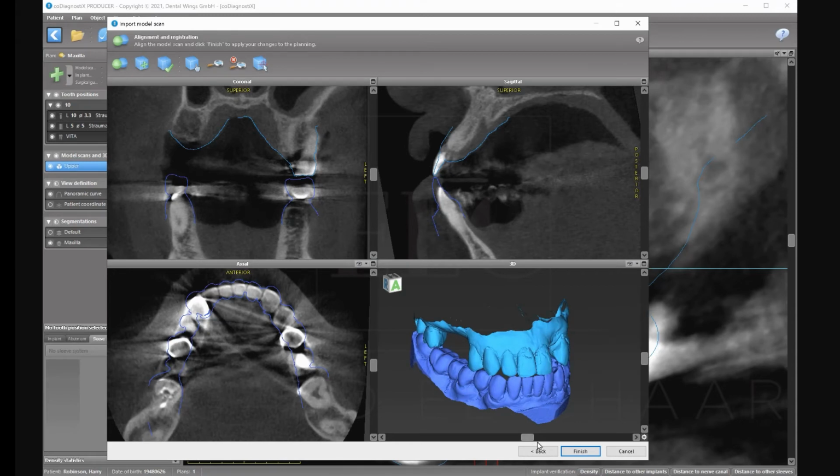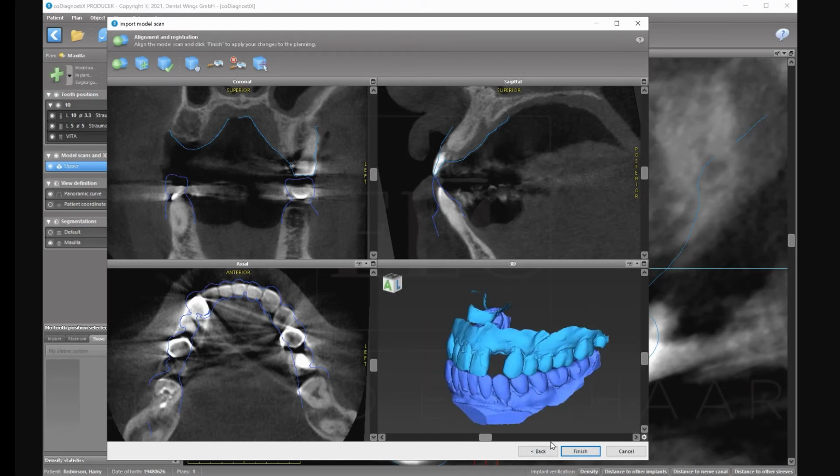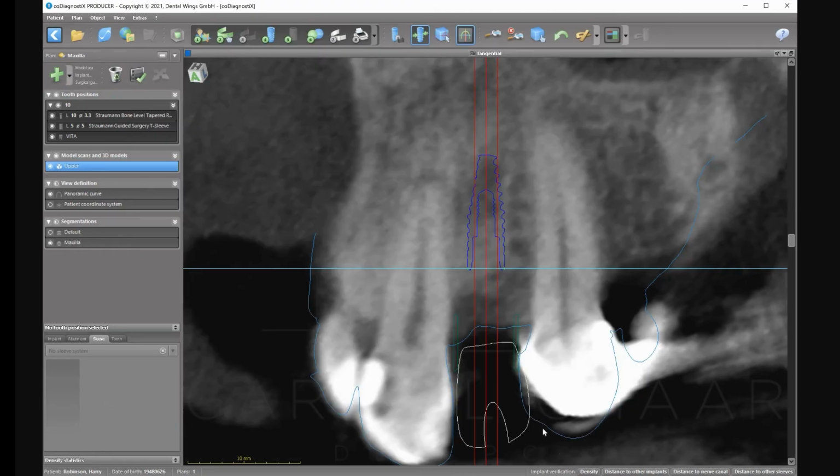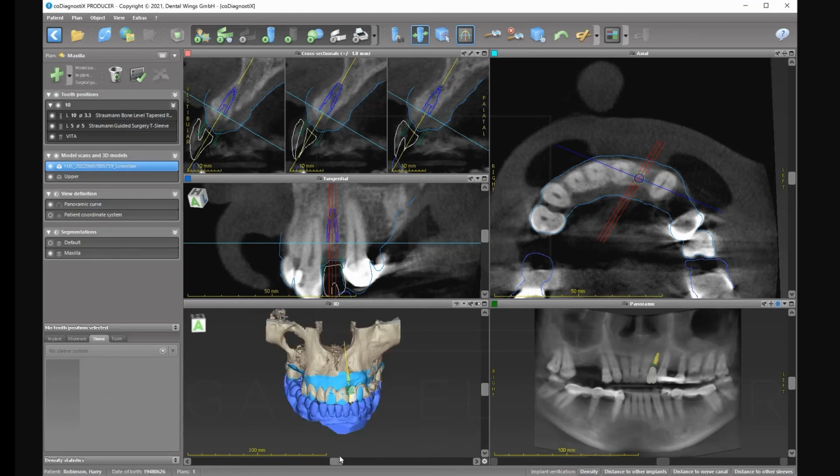Now, why is it important? Because now you can see that the bite is edge to edge here, and it makes a huge difference. So now I go back to my area, close this down, and look at my bite. See this? It is edge to edge. So my planning of this tooth is perfect. Okay, and that's how the cingulum is coming. You can't have a better design than this.